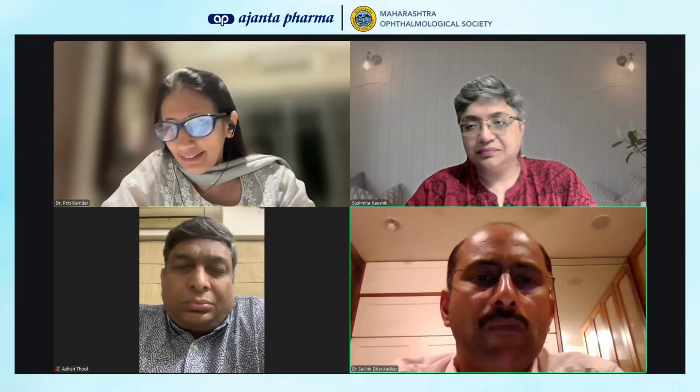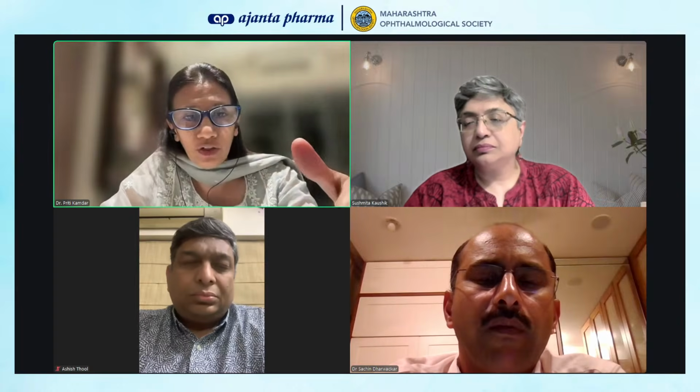For glaucoma, yes, fine. So I would say even for Huvitz, if you are buying that machine because of, say, financial constraints, then I would say use it the same way: look at the raw data first, because it also gives you a disk cube. Even Huvitz gives you a disk cube. Look at the raw data and then look at the statistical data. But take it with a pinch of salt, that sometimes you may not get the same kind of accuracy or retest variability which you would get with other machines. I think that's what would be safer.